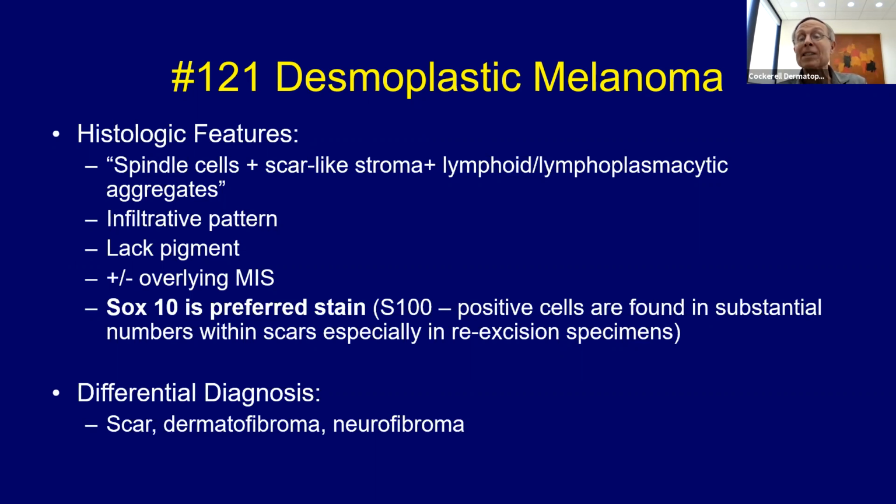non-melanocytic spindle cell process? So they're going to be needing to do some of the immunoperoxidase stains, and we like SOX10 in our laboratory. S100 protein reportedly positive up to about 95% of cases, but not 100% of cases. And I've seen a couple of these over the years be S100 protein weakly positive or even negative. So beware of that. These often don't have pigmentation in them.